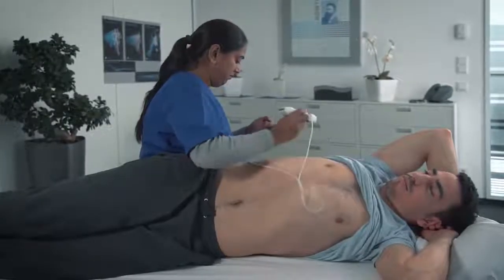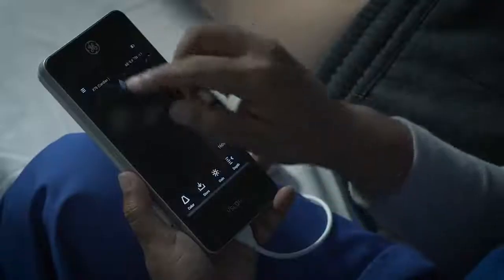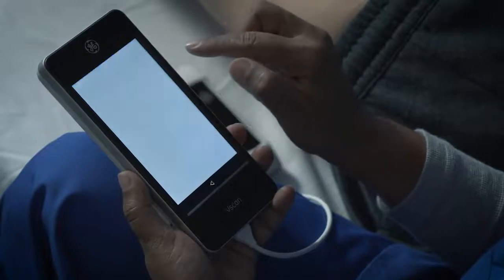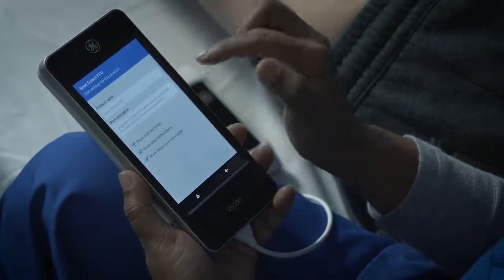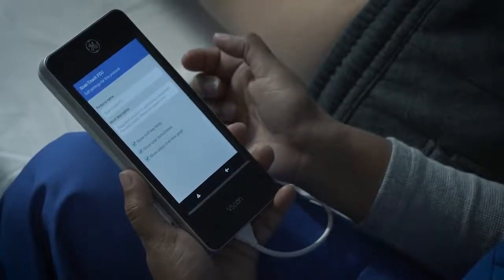Finally, there are additional settings that a user can configure. Return to the Scan Coach FCU protocol through the main menu. Tap to select the settings icon. When selecting hints, suggestions and helpful user interface hints will appear to give you tips to use during the protocol.